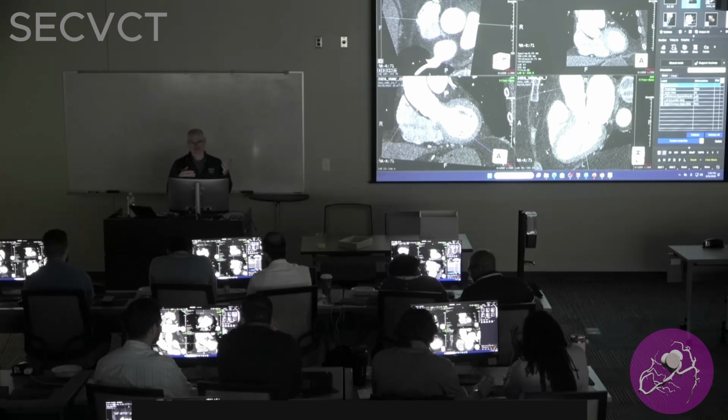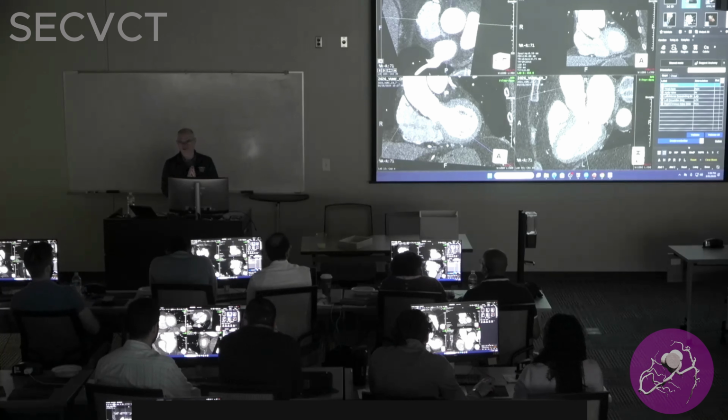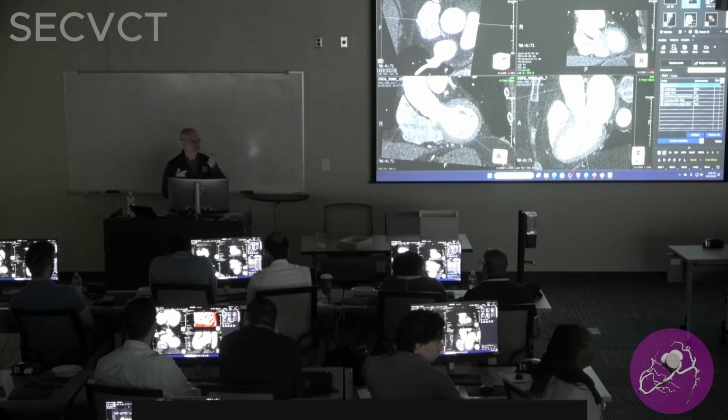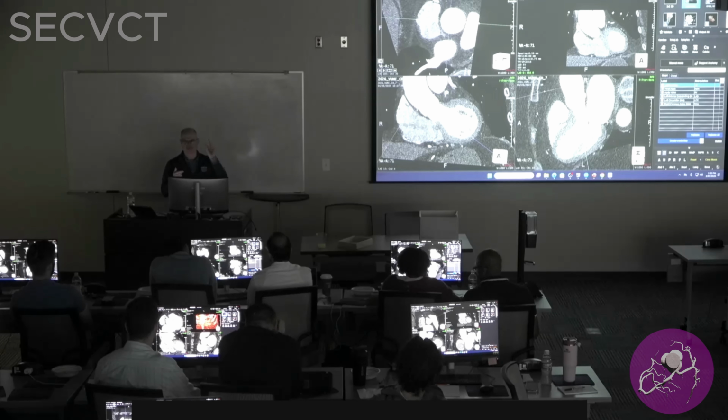Each device probably has some device-specific measurements, but as was alluded to by Joe, for TAVR, we've come to a consensus on what those measurements are, and pretty much all the manufacturers use those measurements. The one thing that I would say, Dia, and you can chime in too, and we'll go on to the next one. I want to mention two things, the ascending aorta, and we'll talk about the annulus.